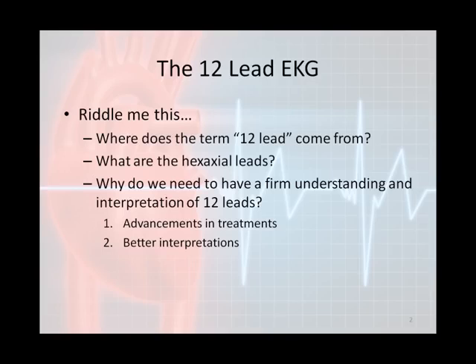Number two, EKG machines can interpret a 12-lead better than healthcare providers. When most people are handed a 12-lead, the first thing they tend to do is look at the interpretation at the top provided by the computer. Many providers of healthcare have become crippled with the advancement of technology and its ability to interpret these results for us. In some situations, this may be called for, but at other times, we need to look at the results of the test to confirm the interpretation and/or diagnosis.